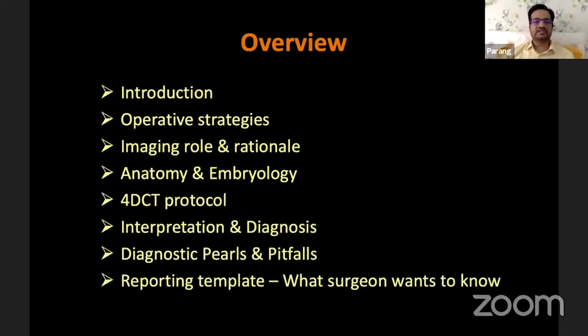Then we'll see the 4D CT protocol that we commonly follow. We'll see the interpretation and diagnosis with many cases. As we go along, we'll discuss some diagnostic pearls and pitfalls which we should all be aware of, to make sure that we don't have any false positive or false negative. And at the last, I'll discuss a reporting template with what the surgeon wants to know and the rationale behind each point.